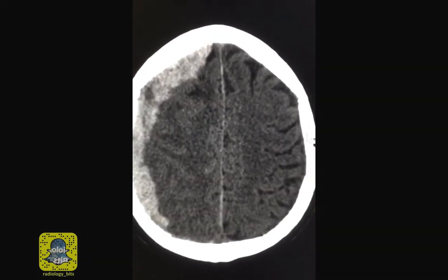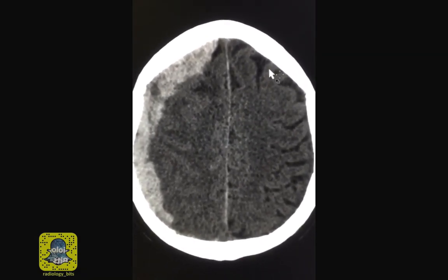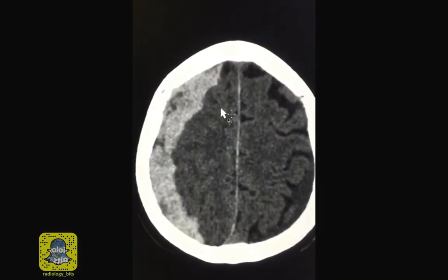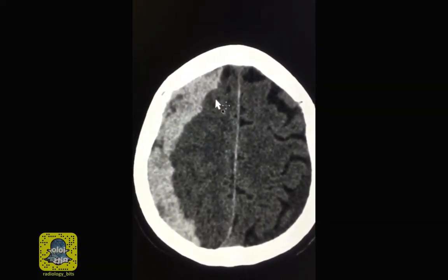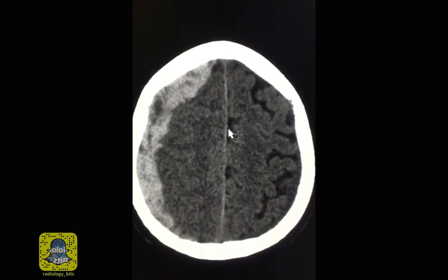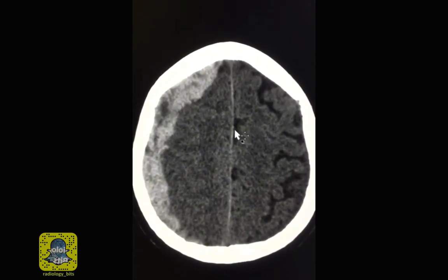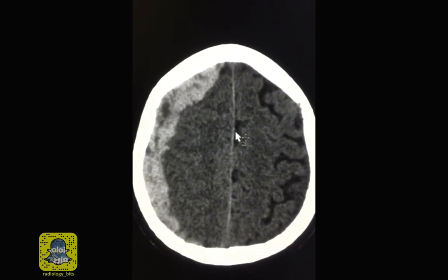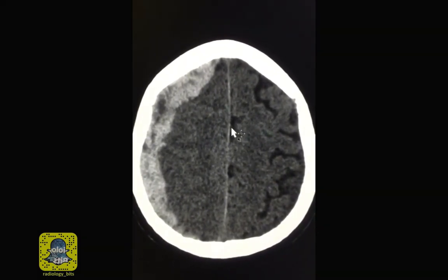We also learned that bleeding inside of the skull could be intraaxial within the parenchyma or extraaxial outside of it. Extraaxial bleeding is subarachnoid hemorrhage, subdural hemorrhage, and epidural hemorrhage. When you see a bright finding on a CT scan that is not bone, calcium, or metal, this is likely hemorrhage. Today's case is a subdural hematoma that is differentiated from an epidural hematoma by several clinical and imaging points. Subdural hematomas occur because of disruption of bridging veins in the space between the arachnoid and the dura. The oozing of blood, because it's venous, is typically slower than compared to that of an arterial bleed.